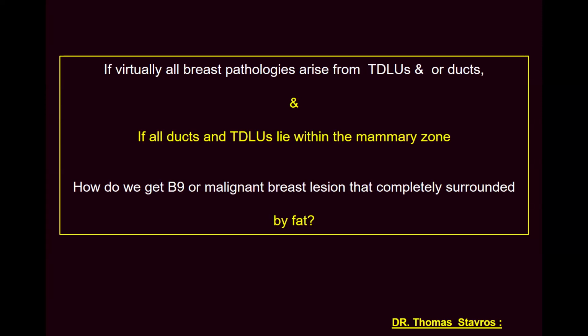So if I have seen cancer or benign lesion in completely fatty breast, from where does this lesion arise?